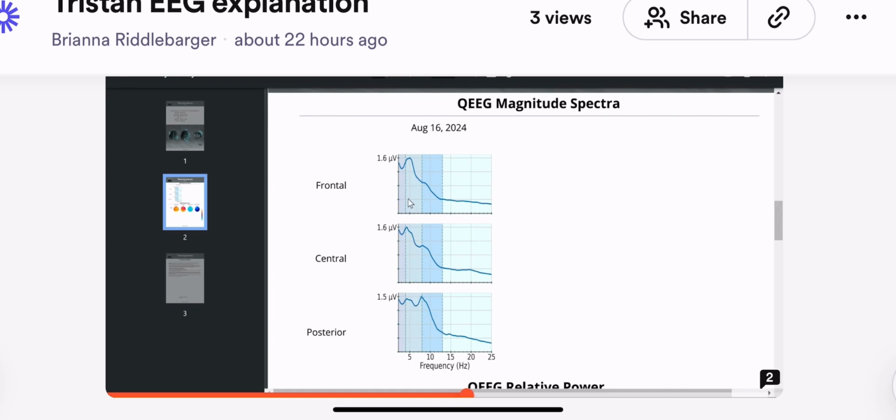This is not alpha wave activity anymore. You see that light greenish color. This is light sleep wave. It's called theta. And basically, this is the prevalent activity we're seeing. We call this a drug bump when you see excessive theta. And so I very commonly see this type of activity in someone who has had a lot of exposure to marijuana or opiates. It's probably the most common.